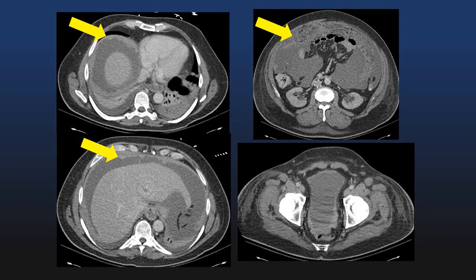Contrast that with this case of another patient with a decent amount of ascites, peritoneal thickening, but in this case, much more nodular appearing and a much more infiltrated, caked appearing omentum. This is a patient who ultimately was given a diagnosis of peritoneal mesothelioma.